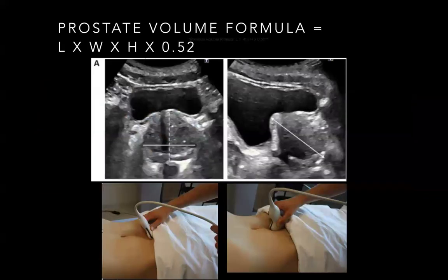So the prostate volume formula is just a tiny little bit different than the bladder volume formula. And the main difference is that coefficient. Length times width times height by a coefficient of 0.52. This coefficient is based off of the shape of the bladder and the shape of the prostate. And so for most settings, most places use this 0.52 for prostate and 0.75 for bladder.